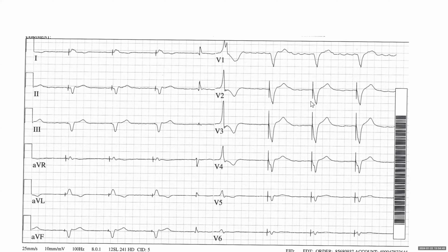So this, by the way, the atrial rhythm gets missed a lot of the time in paced ECGs. People look at the pacing, comment on the pacing, and forget to comment on the atrial rhythm. So for real life, not only for the exam, always ask yourself when you see a ventricular paced rhythm, what's going on in the atrium? Because you might miss AFib when the patient is not anticoagulated and so on.